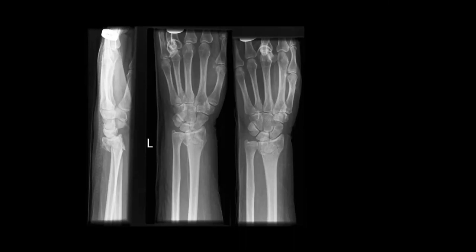So overall, to conclude for this radiograph, if you were describing this fracture, you would say that there is an intra-articular comminuted fracture of the left distal radius with dorsal angulation of the distal fragment. So I think if you said that to your registrar or your consultant, they'll know exactly what you're talking about without having actually seen the image themselves.